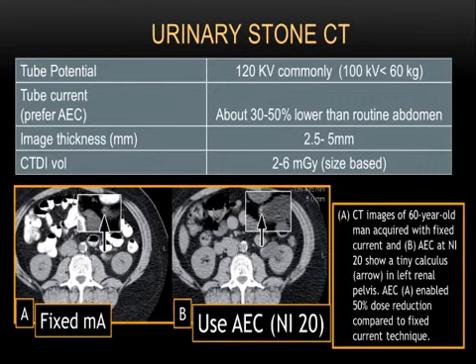If you add iterative reconstruction, then it further improves the sensitivity. We start with a slice thickness of 5 millimeter for kidney stones, and some people might say, is it too thick for detecting small stones? Certain places would go to 2.5 or 3 millimeter. If you are one of those centers that go for thinner slices, you will find that this CTDI is going to be lower than what you need.